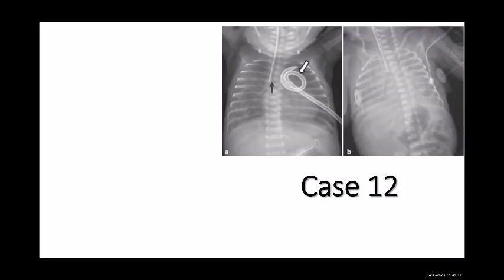Okay. And then the number of ribs, if you count them, 1, 2, 3, 4, 5, 6, 7, 8, 9. So this person is on very high PEEP. I think the PEEP here is almost 10 or 11 because of the number of ribs. However, the lung inflation is not good because I cannot see the border of it. I can see it, but it's not very good. It seems that there was pneumothorax and they inserted the chest tube, but it disappeared.